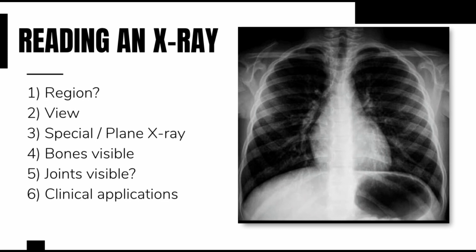Then you have to talk about the view to which it belongs. If it is the antero-posterior view, whether it is the posterior-anterior view, PA view, or if it is a lateral view, or the skyline view, or the oblique. Then you have to say whether it is a special X-ray or if it's a plain X-ray.